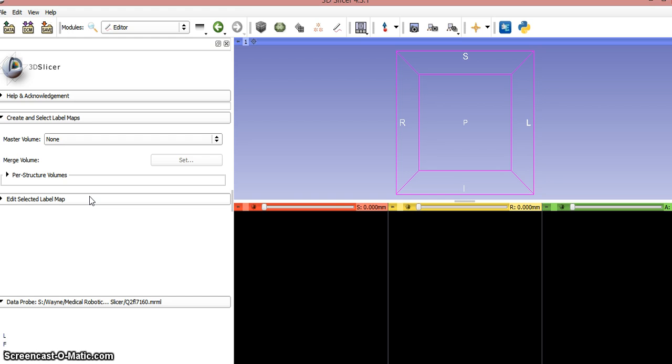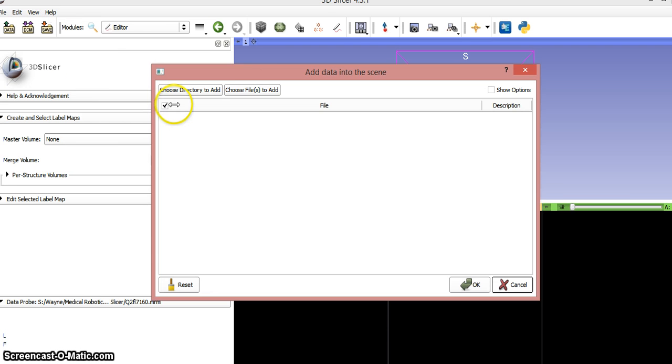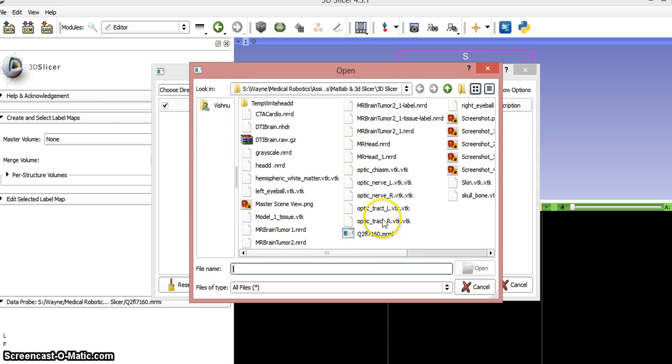I've actually done the segmentation, and I'm just loading and then applying another filter, which is for the second problem, and then I'm going to show it. So now I'm just going to load the data which I had saved previously.